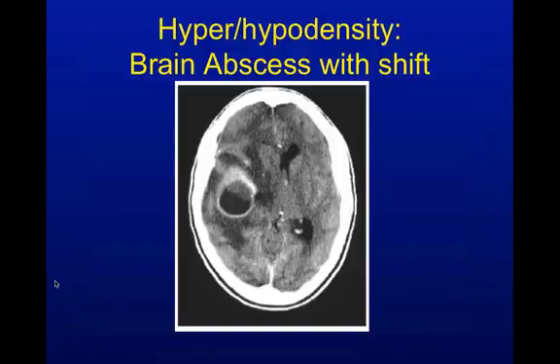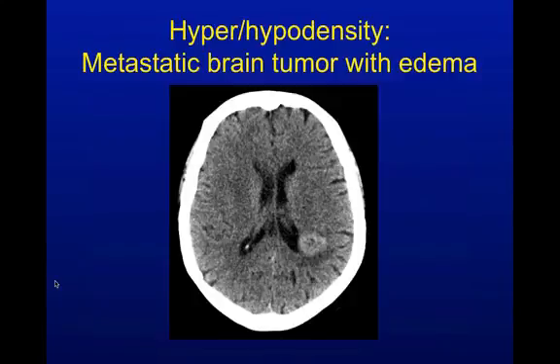All right, nice brain abscess with midline shift. Lots of edema around that. Maybe the patient's presenting with new onset seizures. You can have pretty large tumors inside your brain before you start having symptoms of it. That's always the sneaky thing with those tumors. Here, another brain lesion with vasogenic edema around that. Mass effect.